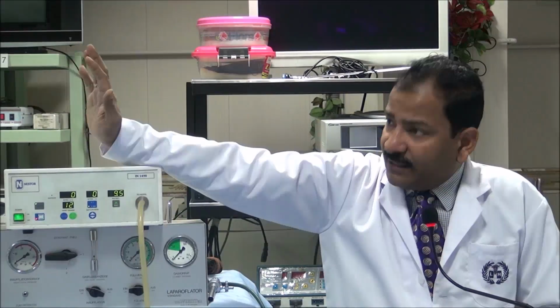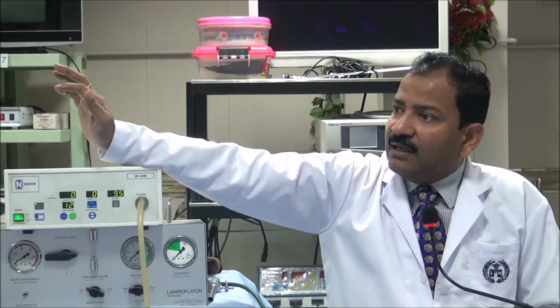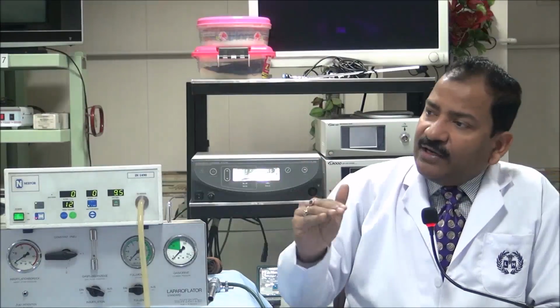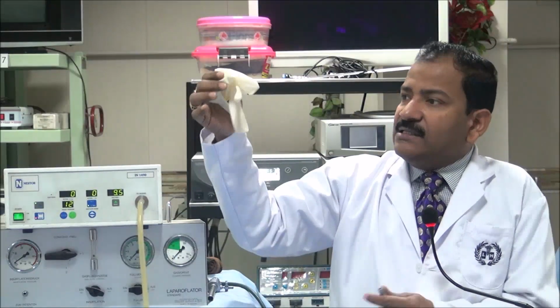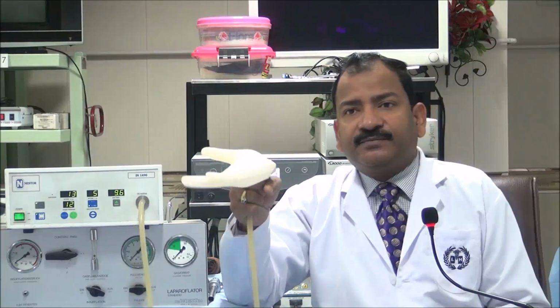It has a limit, isn't it? As soon as 12 is reached, the insufflator will stop the flow, and it is maximally stretched. Just like this glove. I will show you. Start the flow. And it is how much? 12. And it has stopped.